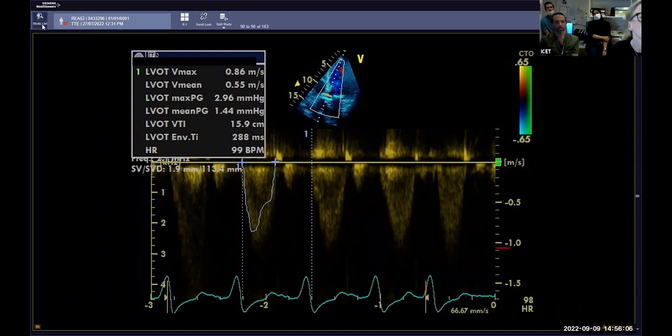Sam, how do I get to you? Just pause share, then you can go back to the study list and click on the little folder section, and then teaching, and then the valves. We only had the one there. I thought we had two. I think you've got the valves as in regurgitation, or the mitral valve is the other one. The mitral regurg one, okay.